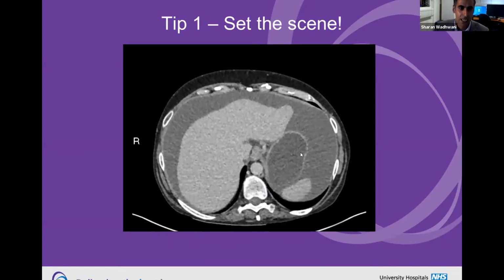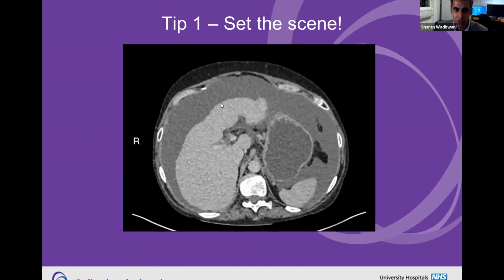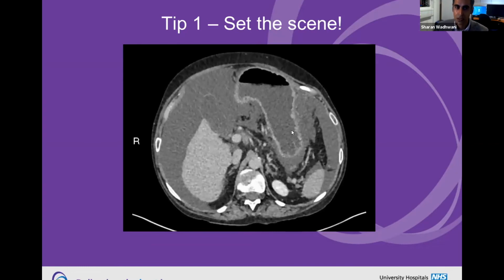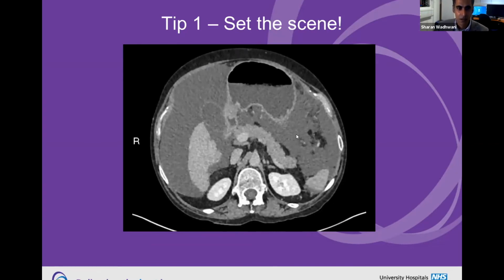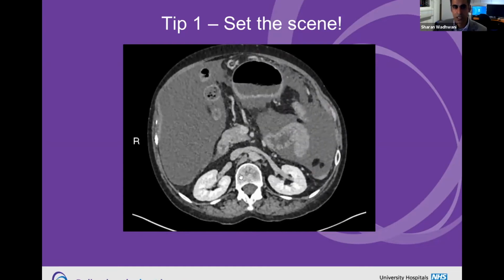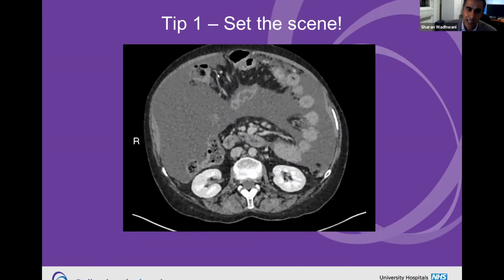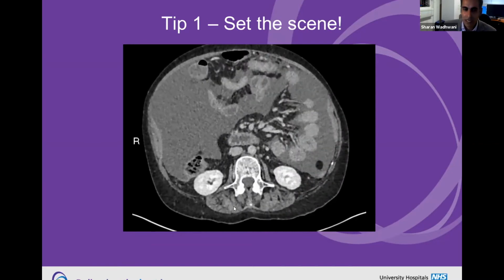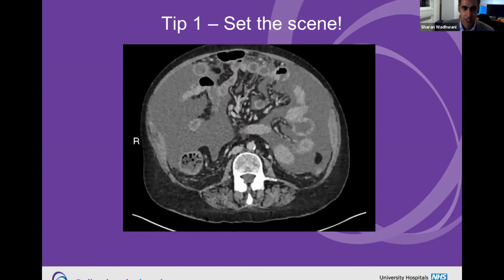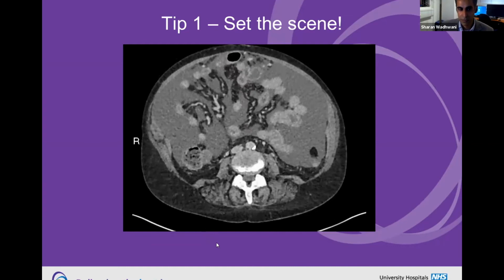We can see here that there's ascites. We can see that there's lobar redistribution and an irregular contour to the liver. The portal vein's patent. We can see that there are varices spotted around the abdomen. So this is clearly a cirrhotic and decompensated patient. When we looked at that liver, there was no big mass that jumped out. So in the context of this talk, looking for liver lesions, it's difficult. We know that the liver is cirrhotic.